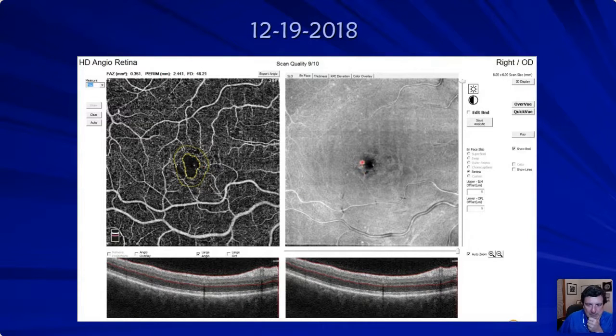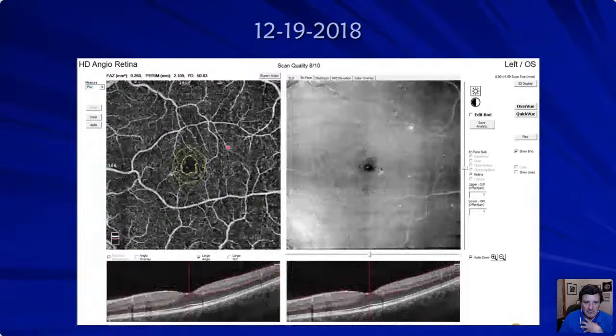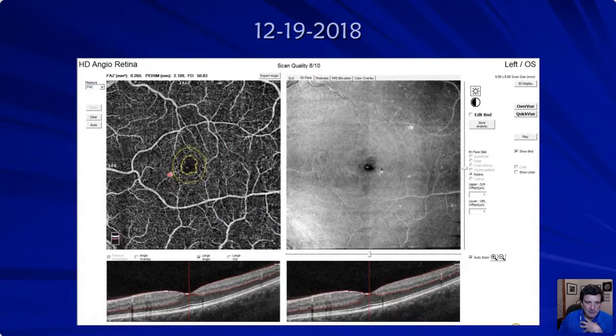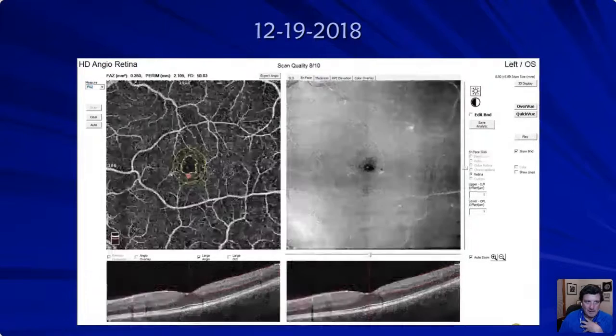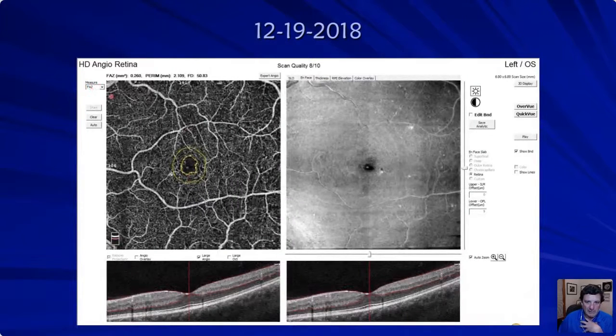You can see over here, there's some exudate or blood. You can't tell on an OCT. They both light up as hyper. So you'd have to use your 78 or 90 to see if this is exudate or blood. And then you would look and you see this dropout area right here, that it's becoming distorted. We're picking up and following and managing diabetes at a very, very high level. Look at these microaneurysms right here. Look at the dropout that's occurring. But it's definitely worse in this eye, the right eye, than the left eye when we're measuring that foveal avascular zone.